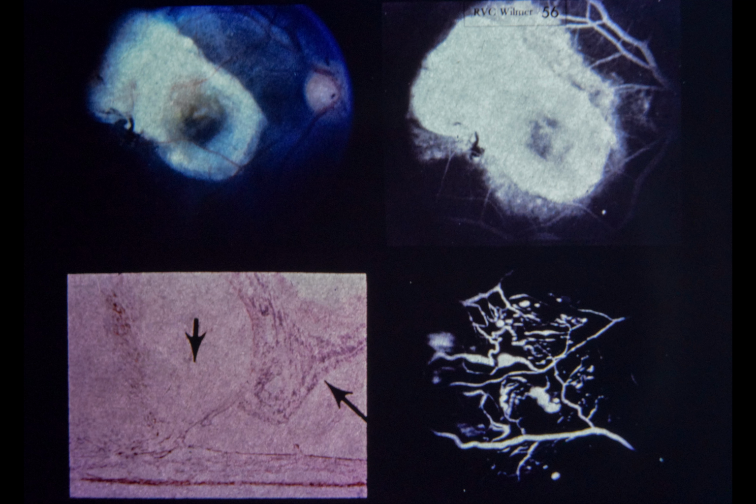Upper right, nodule stains with fluorescein 2 minutes after dye injection. Lower left, in histologic section from another patient with similar clinical findings, large arrow points to disorganized retina, and small arrow lies in center of fibrous tissue which has replaced sensory retinal elements. Lower right, in fluorescein angiogram of retinal periphery, note characteristic retinal vascular abnormalities. In addition to telangiectatic vessels, note capillary closure adjacent to and peripheral to dilated vascular bed.